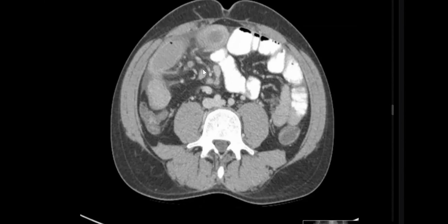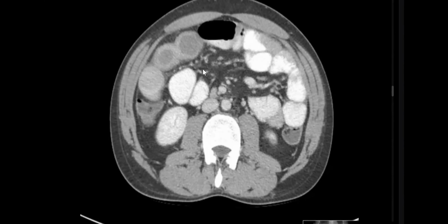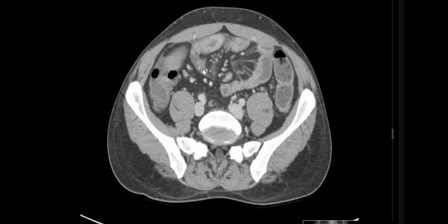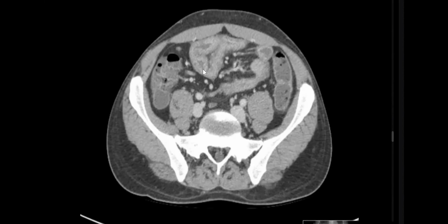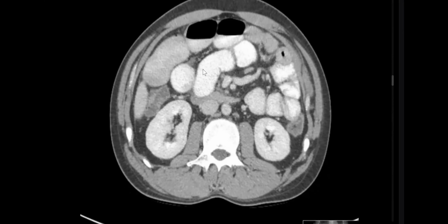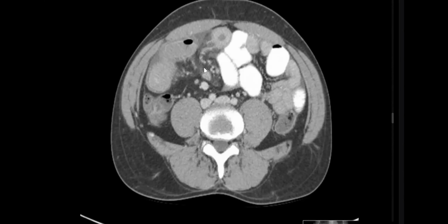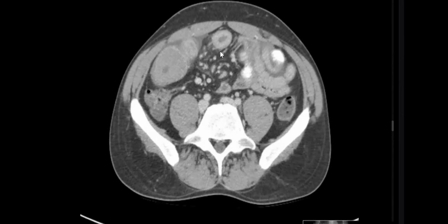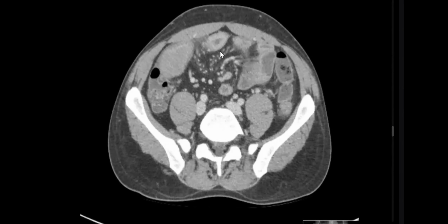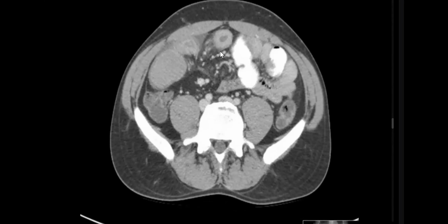How many times did you go up and down in this study? So many times. In the exam, one or two maximum, because now you lose concentration. You detected an abnormality, which is bowel. Very good. Is it a focal segment or multiple segments? You should mention this point. Is it hyper enhancing or hypo enhancing?